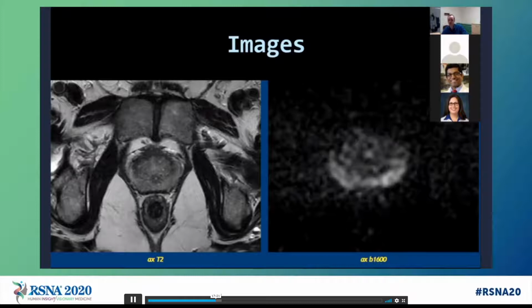And also with that sort of cellular appearance to the peripheral zone, you tend to have mild restricted impeded diffusion and often some early enhancement on the DCE as well, which makes it a very difficult gland to interpret, and on that background to exclude something more significant underlying. I don't know if that's your experience as well in the younger patients.